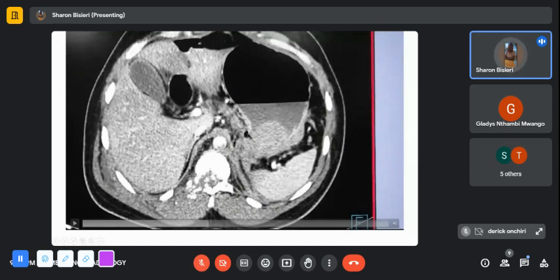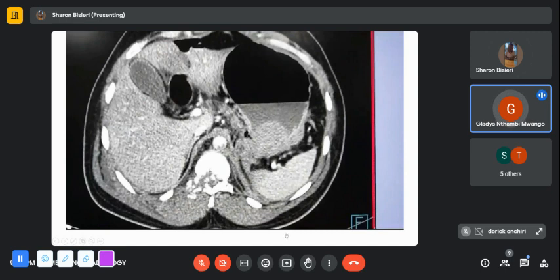So we had a cluster of findings in this specific patient. The patient was quite injured. The spinal canal was markedly reduced in size, so the cord most likely was also injured. And this is a patient who would require an MRI.